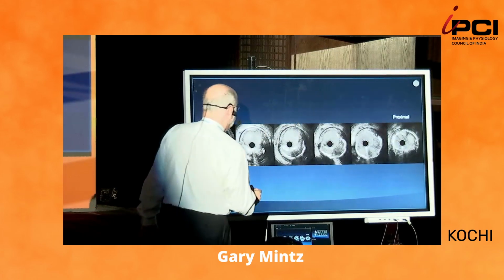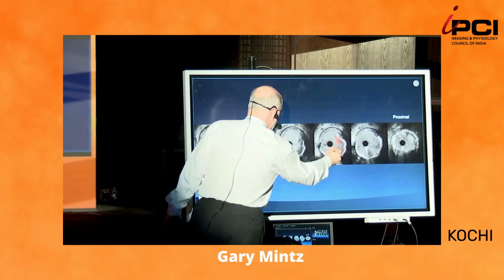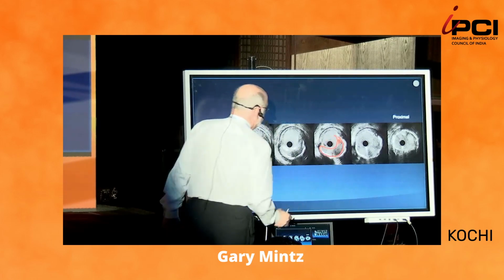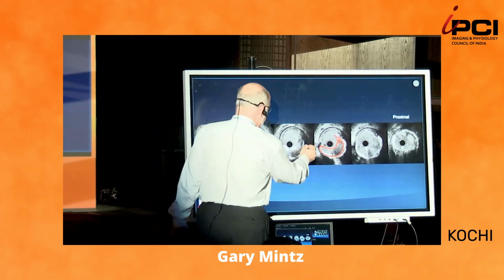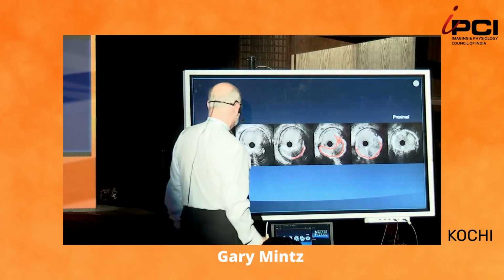And you can see here is the site of rupture, and here is the cavity. They very often have calcium at the base. I'm not sure I understand why, but I know that they do.